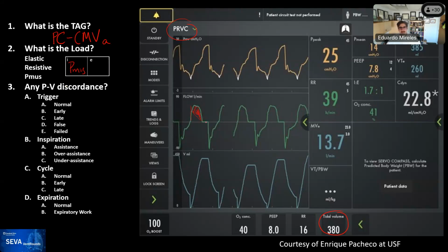It's activation of the inspiratory muscles, and then during expiration, we have a very rapid drop on the expiratory limb, and rapidly goes into it. And so it's hard for me to see it, but at least the initial parts of it would be consistent to me with somebody that is either very elastic load or is going into inhale rapidly. Rob? Yeah, it's real hard to tell that one. Yeah. So I would say elastic versus question mark.